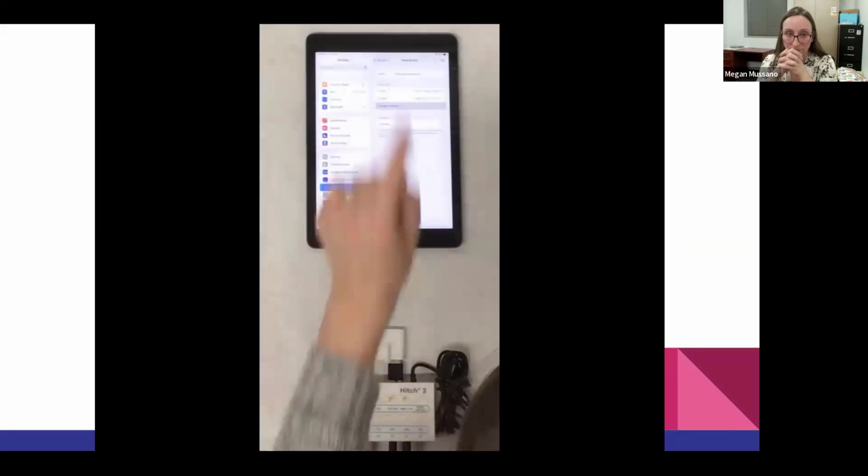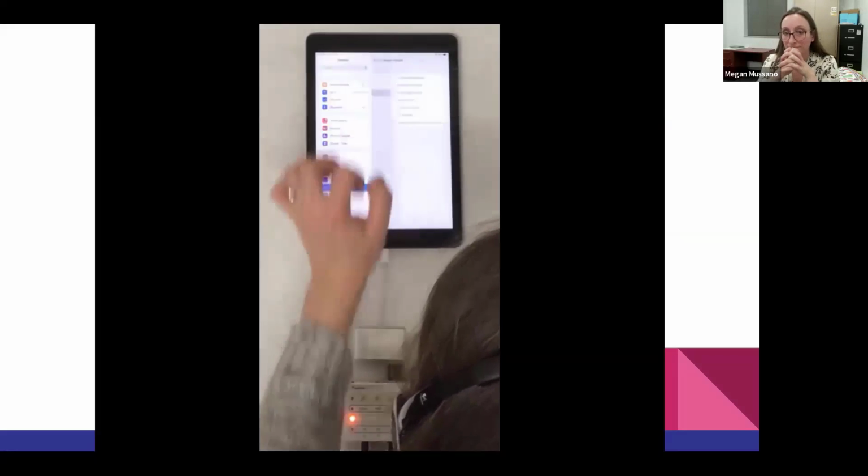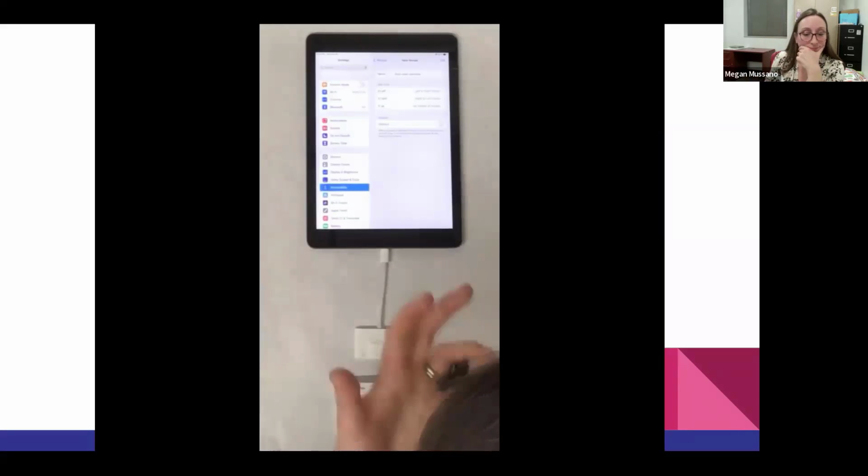that will move our book forward. And then the up arrow is kind of like a pointing, and that I'm going to use the up arrow as tap middle of the screen. You can assign any switches, any names to any function. This just made the most sense for those actions, and we were trying to make this as easy as possible for each student's assistants, parapros, teachers, parents, and just kind of make it a little more foolproof. So that is why we decided to go orange up, left, and right as our recipe.